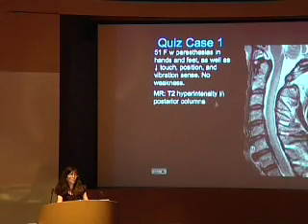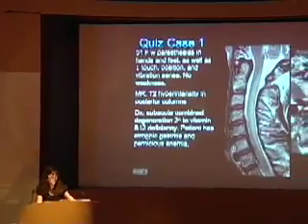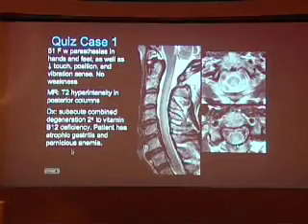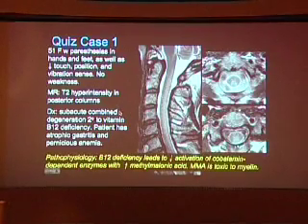Okay, so we've got this hyperintensity in the posterior columns, and this is an example of subacute combined degeneration secondary to B12 deficiency. And it turned out that this patient had atrophic gastritis and pernicious anemia. Again, maybe more the province of neurology than neurosurgery, but if you do see this appearance out there in the community, once you grow up and go into practice, maybe your radiologist isn't going to know what's going on, and you're going to say, Mrs. Jones, I'm going to check your B12.